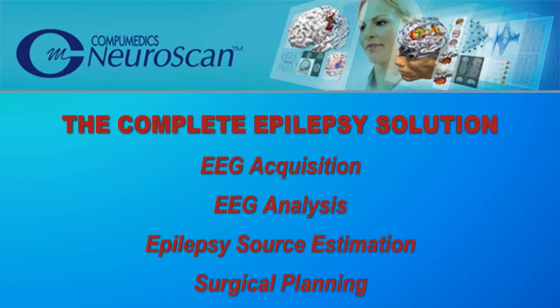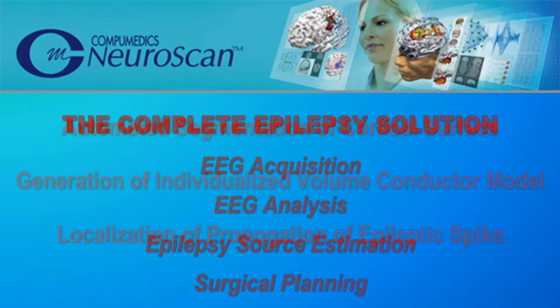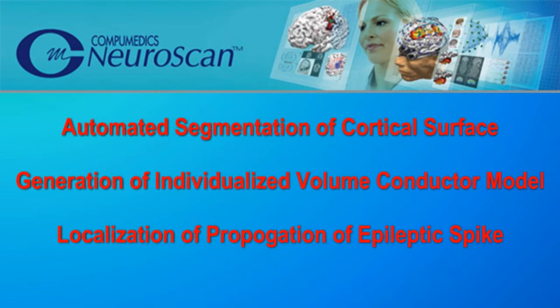Compumedic's Neuroscan provides comprehensive solutions for epilepsy, beginning with EEG acquisition to EEG data analysis, through estimating the source of the epileptic activity and assistance in surgical planning. The first step in estimating the location of an epileptic source is the generation of an individualized cortical surface.